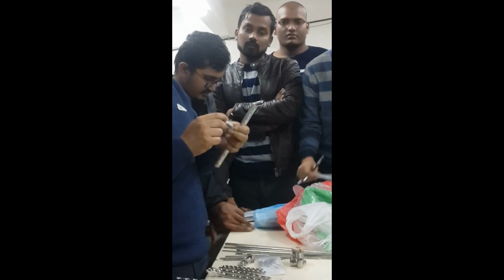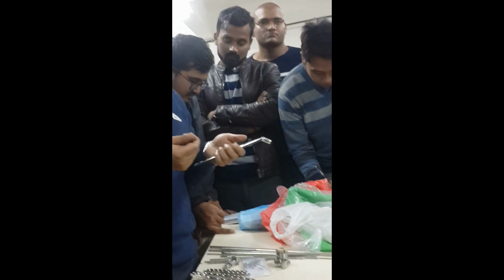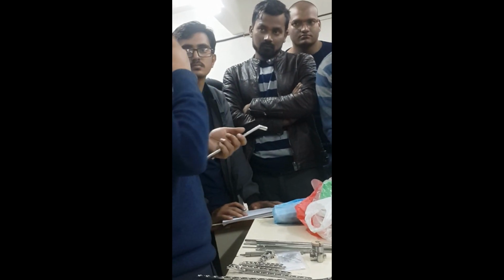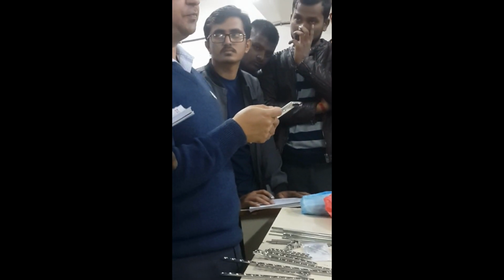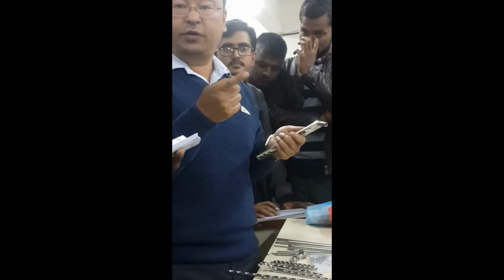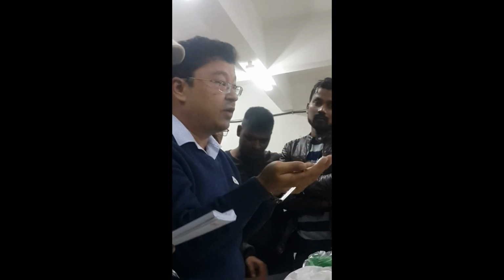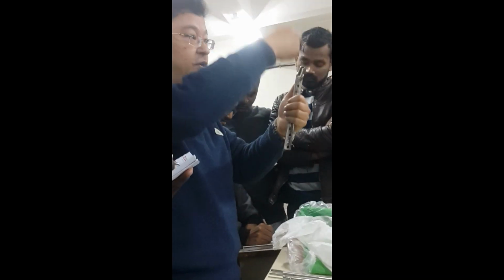Okay. And what is it used for? Intertrochanteric fracture. Intertrochanteric also, if it is not a reverse oblique. Okay? Intertrochanteric fracture means a fracture from the greater trochanter to the lesser trochanter. Greater trochanter is here, lesser trochanter is here, and the fracture is coming from the GT, not from the LT going down like this. If it is going like that, that is known as a reverse oblique fracture. Then this implant will not work, because compression is on them.